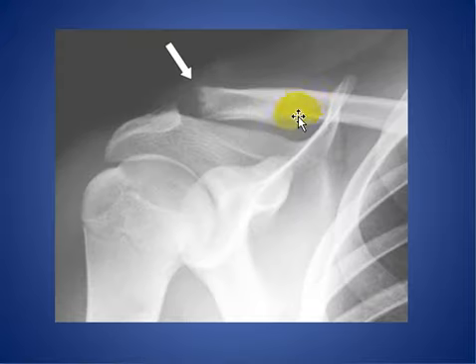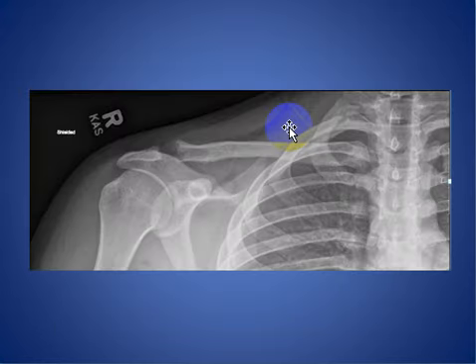Here, another patient with resorption of the distal end of the clavicle after trauma, post-traumatic resorption. Here, another patient with distal end clavicle osteolysis.